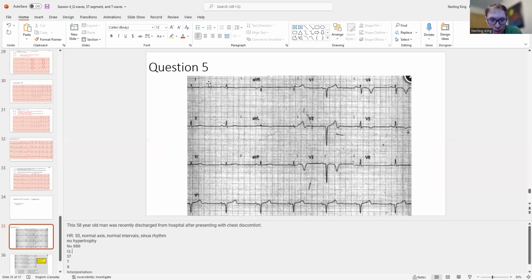I'm just going to read this thing and we're just going to move on. None lateral, none inferior. There is some precordial. So V1, 2, 3 precordial. ST, no. Looking at lateral, nope. Inferior, no. Precordial, maybe V1. Maybe V2. Yeah, I'd say V1, V2 are kind of elevated.